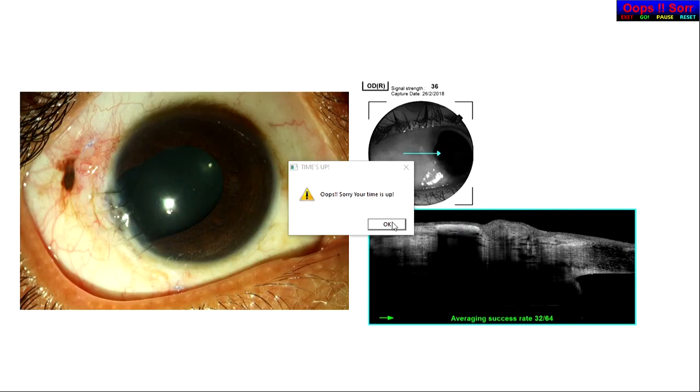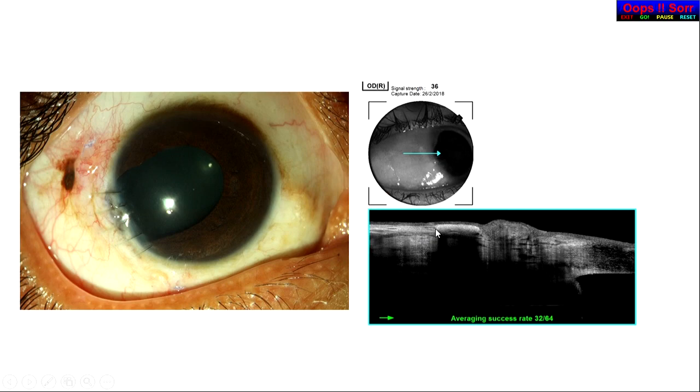So this foreign body was not suspected here. It is not through the area of pigmentation. It was somewhere here that we found this foreign body sitting right underneath the conjunctiva and the sclera. I can tell you because I operated this case myself. There was a thin layer, it can be a fibrous capsule also, which was noted, but it was just anterior itself.